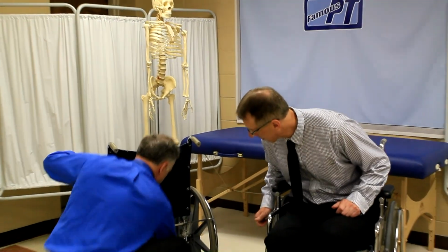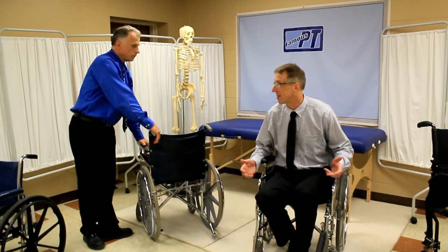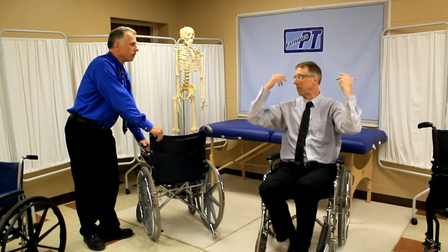The good thing about it is if you're playing sports at all, playing basketball, I've seen this already happen, because it's happened to me. You catch a ball, and you grab like this, and you actually end up flipping over backwards.